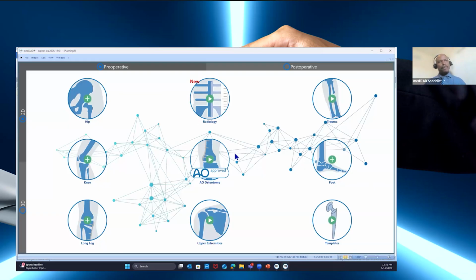This is the 2D, that's the marketplace. With the 3D, you can do simulation. You can see the patient anatomy, the joint, in 360 degrees. You can analyze it much better. You can zoom in, zoom out at any angle, and so forth. You can see the component much better inside the femur or inside the joint. You can analyze the acetabulum much better. You can analyze anything within the joint much better, right? And so it gives you a much better understanding of the patient's joint anatomy.